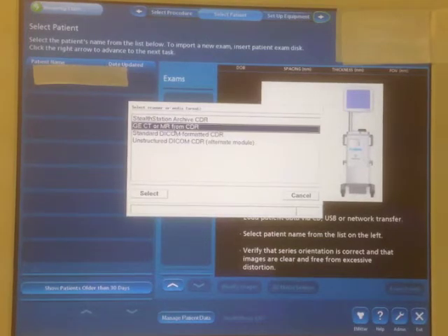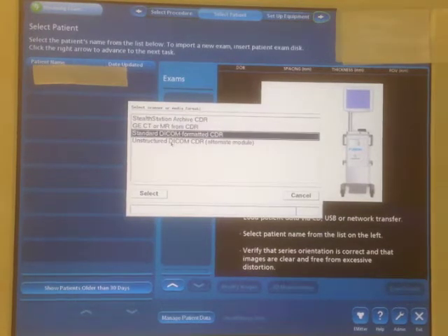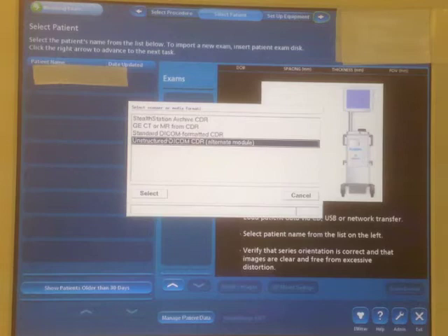At one of our institutions we use a GE scanner. If you don't know or are unsure, then DICOM standard formatting will usually work. The unstructured DICOM will work with the widest array of image data sets, but it takes the longest to upload.